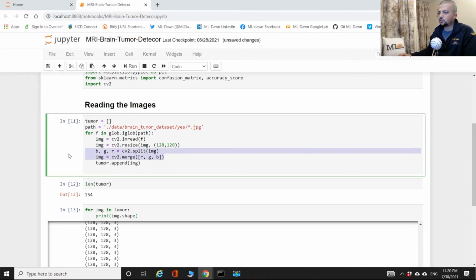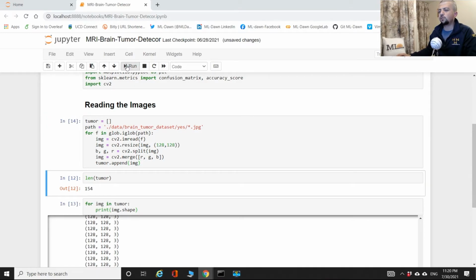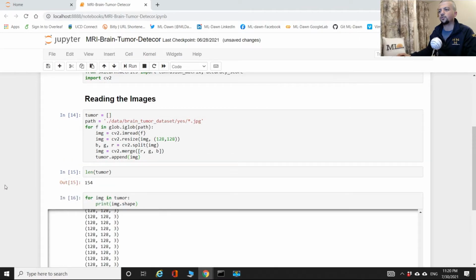Again, remember, these 2 steps are not really essential, but they are conventionally correct, right? So that's what we did, and now we've got the tumor images and everything seems fine. Now let me run this again. Hopefully all is good still. Okay, great. So everything ran, everything was perfect. So we're grand with that, right?